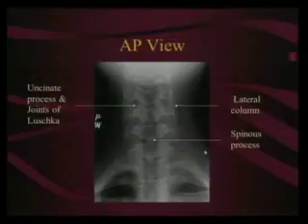This is key. Because they should look like undulating waves. The key with that is it has to be symmetric. Dr. Hellman used to always say, God loves symmetry. And the spine is one of the primary places to look for that. So when you're looking at the lateral masses and the lateral columns, they have got to be symmetric. I have some cases that we're going to see here in a minute. So, nice and flowing and symmetric.